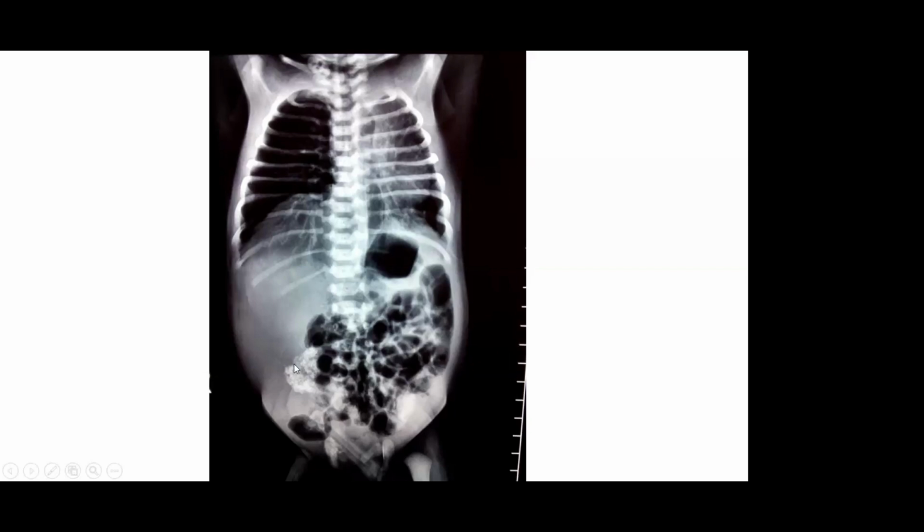Can you see these calcifications, which are as dense as the bones? It is an overexposed film where the radiation exposure is much higher. You cannot see the vascular markings except those behind the heart. So this may be antenatal perforation or maybe peritoneal calcification. These are nothing but peritoneal calcifications, which may take you by surprise.